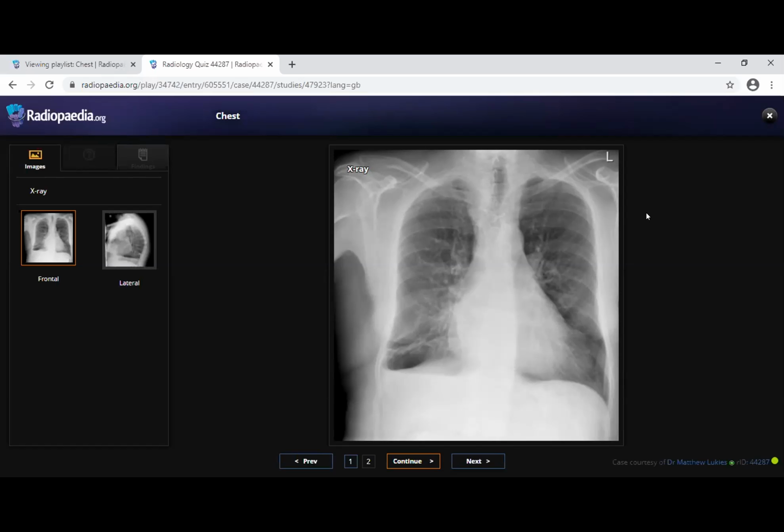I would like to compare with any previous image and ask about the history if the patient is a cardiac patient. If not cardiac, yes, so he's a known case of cardiac, mitral valve disease. Yes, this is a normal-sized heart shadow, but I see a double contour right cardiac border, could be left atrial enlargement with splaying of the carina and right-sided pleural effusion.